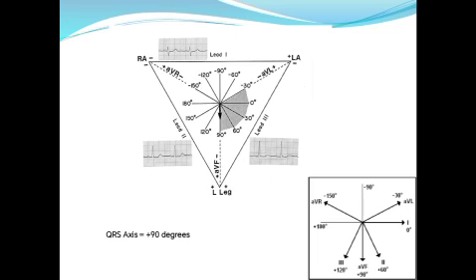Another example. Which one is equiphasic here? This one. This time lead 1 here is more equiphasic.